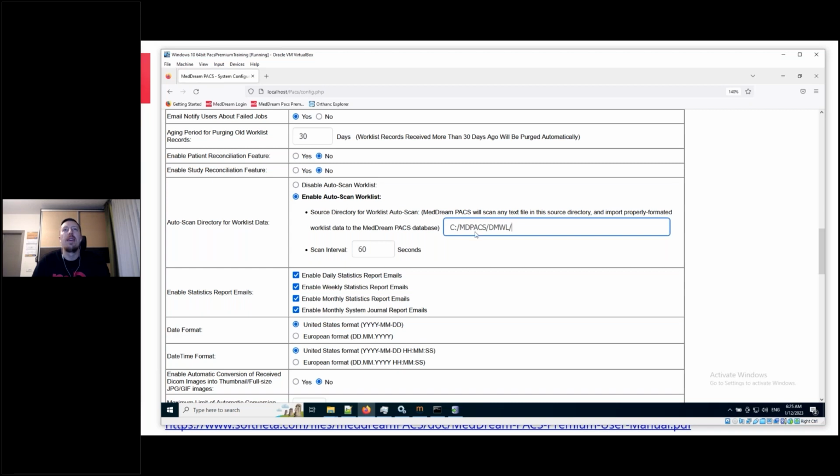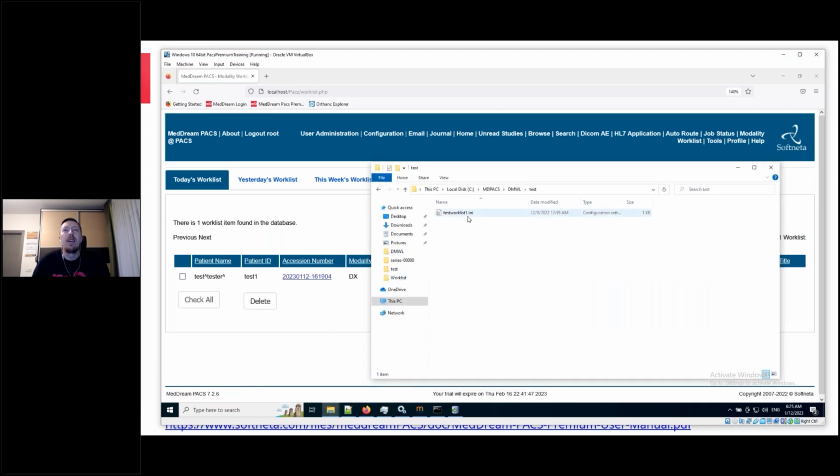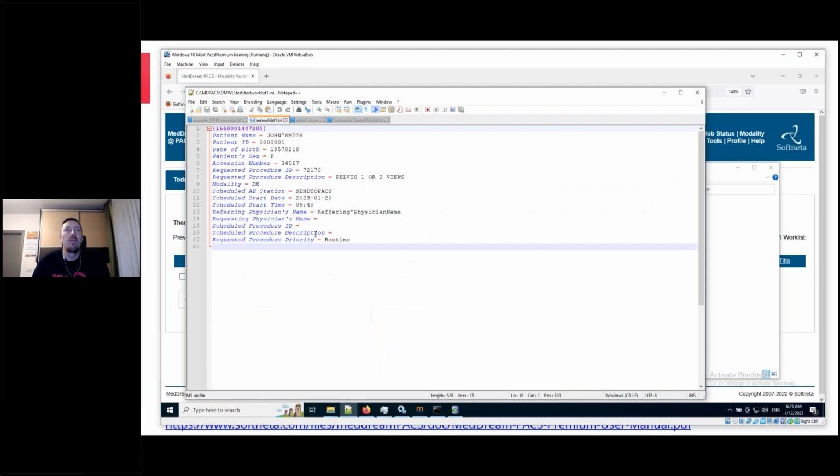As I already have this enabled, I can come back here. I have already prepared the ini file for you. This is how it looks. It's the same as in the slides I showed you.